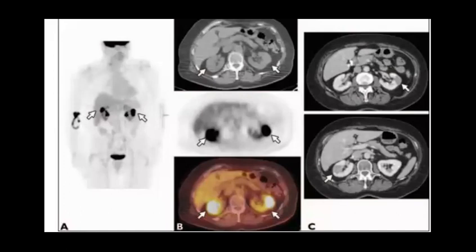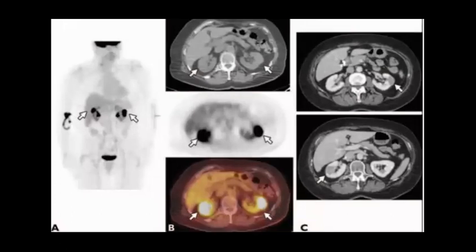This patient is 72 years old, with a history of something. Let me surprise you. You can see any uptake. Look at the CT first. This is a non-contrast CT. Then you can see after the contrast how it looks. So don't rush into a differential. Let's first go to the description. You can have a hypodense lesion here and also here. So it's bilateral, perfect.